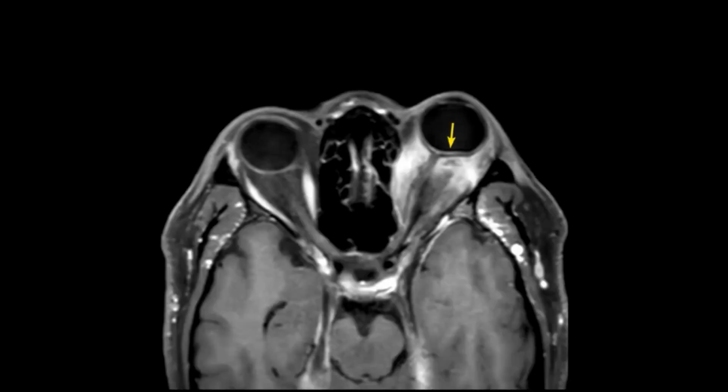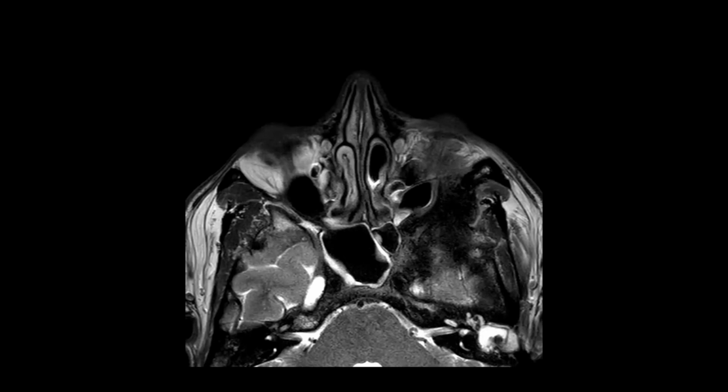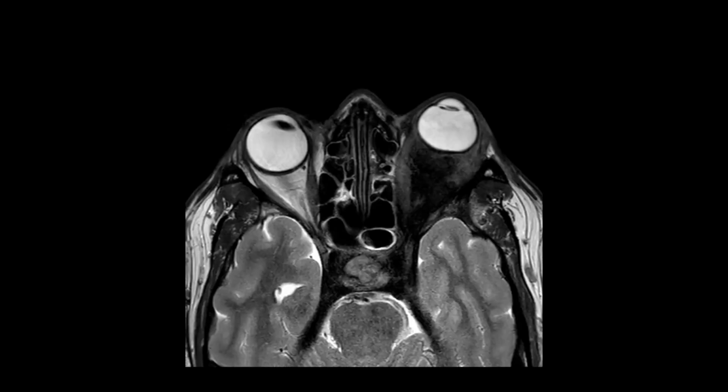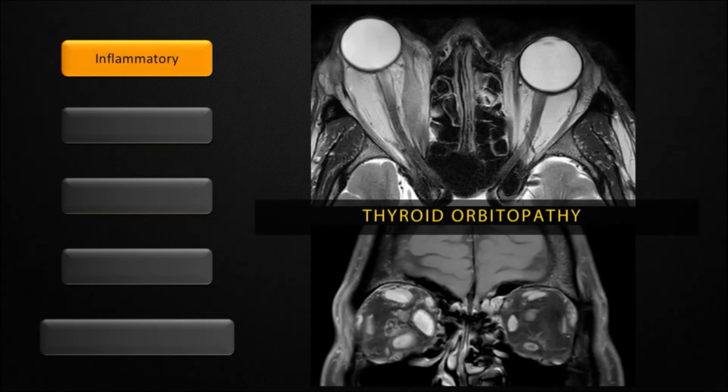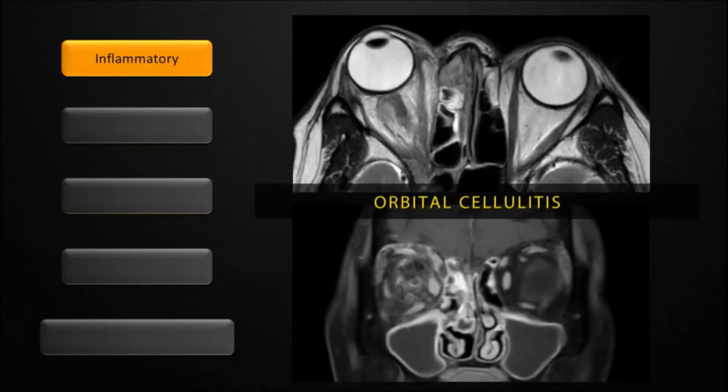Globe distortion and optic nerve compression was present, and the lesion extended posteriorly across the inferior orbital fissure, inferiorly along the left carotid canal up to C2. Similar T2 hypointense lesion involving the dura was seen extending into the left cavernous sinus and the infratemporal fossa. He was diagnosed to have idiopathic orbital inflammation, that is, IgG4 related disease, and responded well on being treated with IV methylprednisolone.